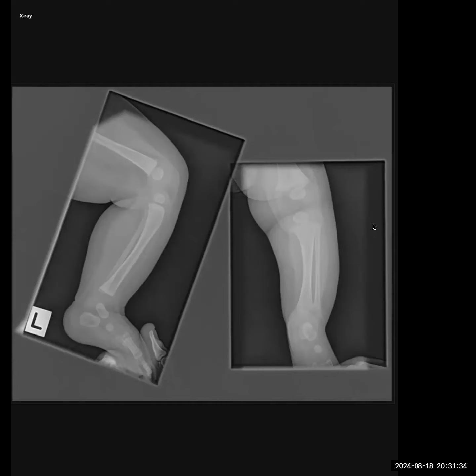In my routine practice, I would just zoom this image up, because if the patient has come with a history of a fall or knee pain, I would be concerned about this being a metaphyseal corner fracture. You're talking about the femur, right? Yes. Let me just assure you the femur is normal.